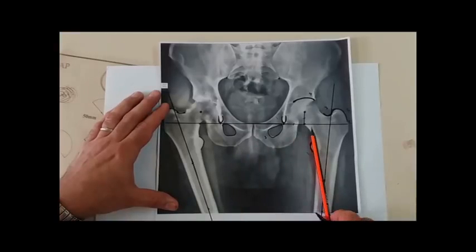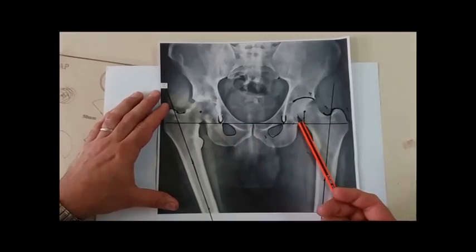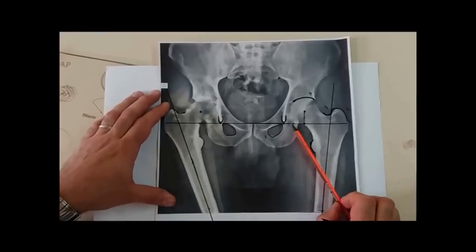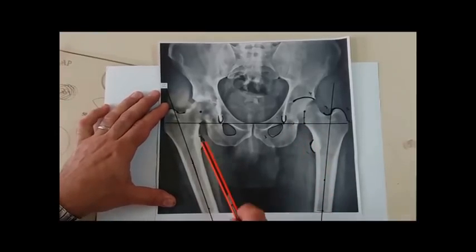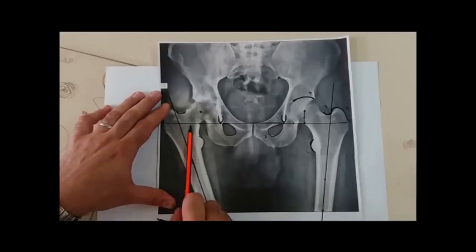So when I am comparing the offsets, the hip lengths, and all the comparable criteria for the right and left, both femurs should be in the same position regarding abduction and adduction. How can I make this? Usually by software, by digital planning, it is easier just to map this line and give an instruction to the software to abolish the abduction.